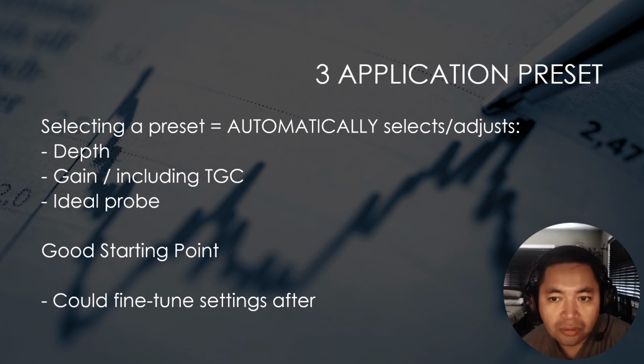One would then need to fine tune the ultrasound image using steps 4, 5, 6, and 7: depth, overall gain, near far field gain, and time gain compensation, and then focus. Now, do take note that not all machines would have adequate presets, so one would have to do this image tuning manually.